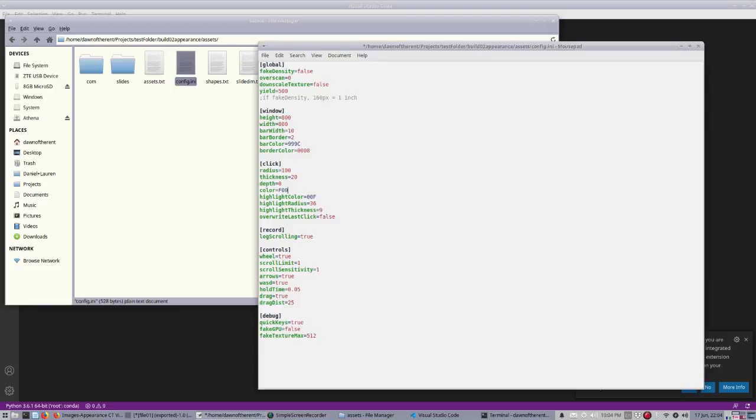And then for the highlight radius, let's make it an actual circle instead of a ring. So I'm going to make it 50 pixels. And then if I make it 50 pixels thick, then it'll be a complete circle. But since it's a complete circle, let's add some opacity to it. So let's make it pure white. So all red, all green, all blue, and 4 opacity.